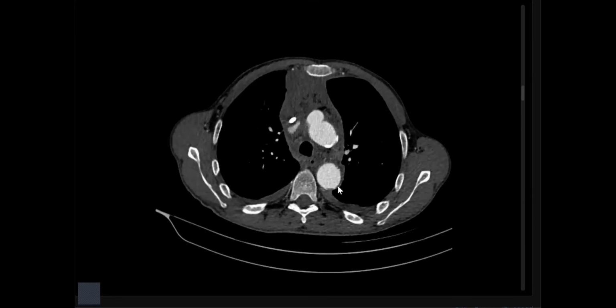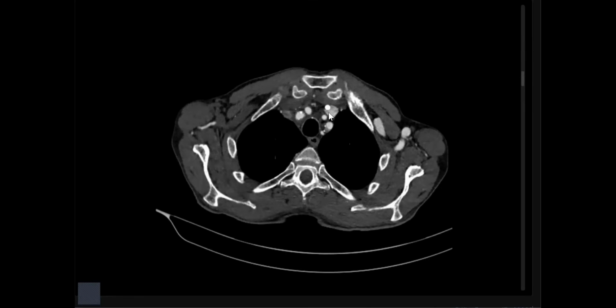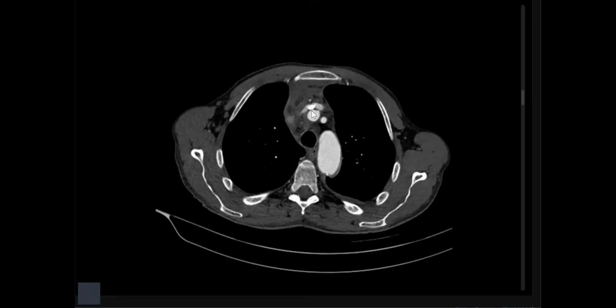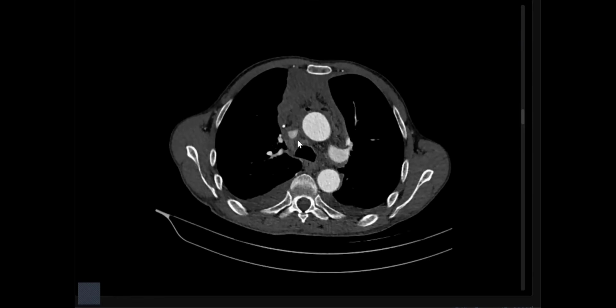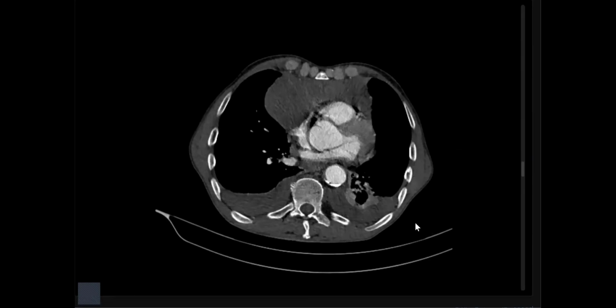You can scroll again from the start. Okay. Yes, sir. So I can see that the catheter has been inserted by the left subclavian or internal jugular vein, and then it has pierced beyond its wall margin, and it is extending into the mediastinum. So this is a venous injury, and there has been extravasation of blood into the mediastinum, and there is also bilateral pleural effusion.